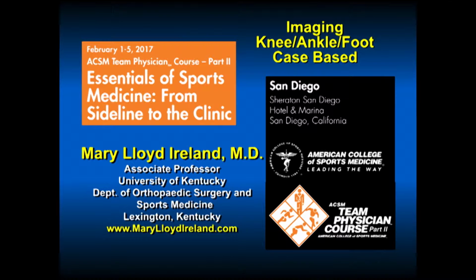This talk is on imaging. I'm going to show you some cases that I've taken care of and try to correlate the imaging, the physical exam, with what we find at the time of surgery. This will be mostly involving the knee, but I'll show a couple of ankle and foot cases.